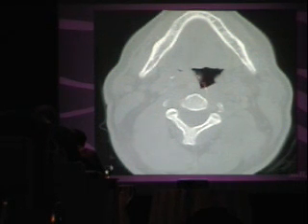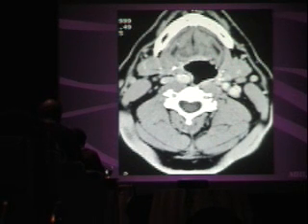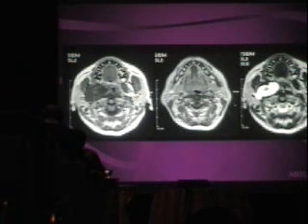So this was, can you please biopsy this parapharyngeal mass, which we think may be a squamous cell cancer of a lymph node, and you give some contrast, and it's just a very medial course of the carotid artery, what's called the kissing carotid. We're going to keep coming back to this theme: at every level along where the carotid artery may flow, just give contrast if there's any doubt that something may be a carotid. And when you're looking for flow, by the way, CTA is always better than MRA, because you're actually filling that lesion with contrast. And even gadolinium MRA still has a lot of flow-related artifact, so it's never as accurate as CTA.